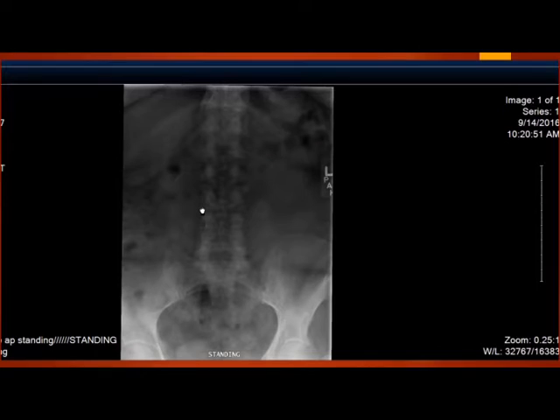So as in every single spinal case, I went through the process of ordering the flexion and extension radiographs, and let's take a look at those radiographs now. Okay, so here we are at the X-ray images, and I have the AP lumbar here in front of us, and you'll notice that this particular set of X-rays has a different interface than the X-rays that we reviewed with regards to the cervical spine.